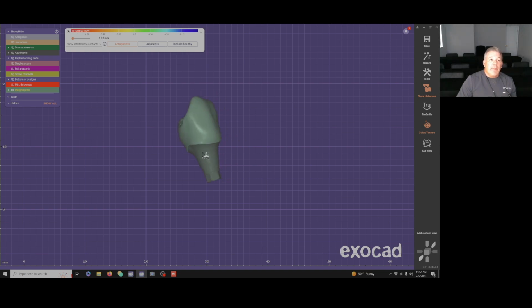And better than a tie base, I think a custom abutment is going to give you more support on the crown, because you'll have support over the whole length of the crown, whereas a tie base would be real small and just a little portion of it underneath the crown. It'd be a lot weaker and much more likely to debond in that area than it is here.